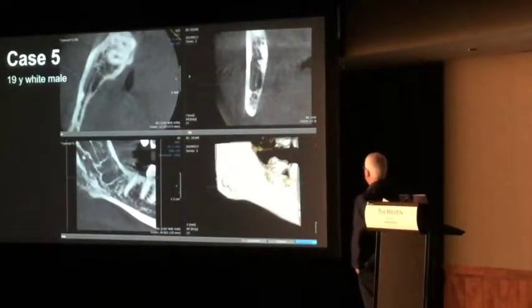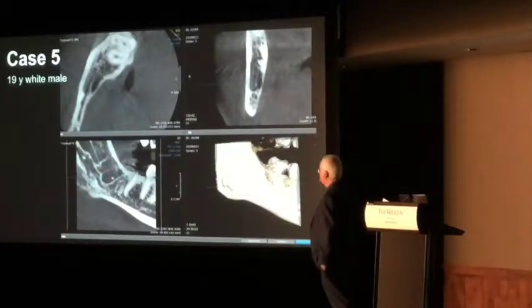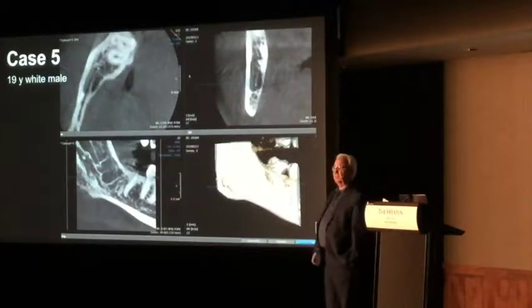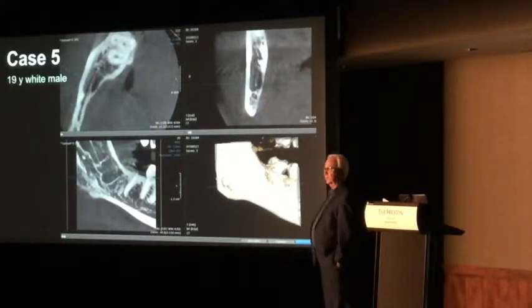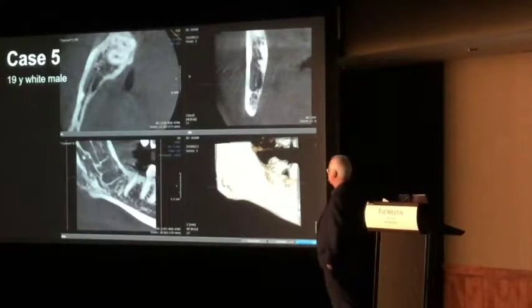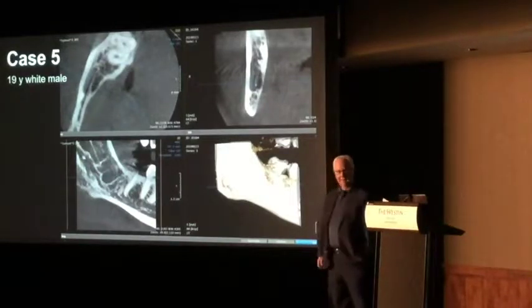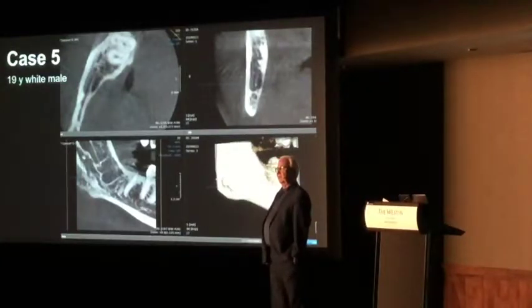Last one. This is when a tooth has been extracted. Sometimes I get these cases where there's been impingement on the inferior alveolar nerve canal, or somebody put a bone burr and traumatized the lingual cortex and maybe damaged the lingual nerve, and they find a neuroma surgically, and we go to court. But a lot of teeth just heal.